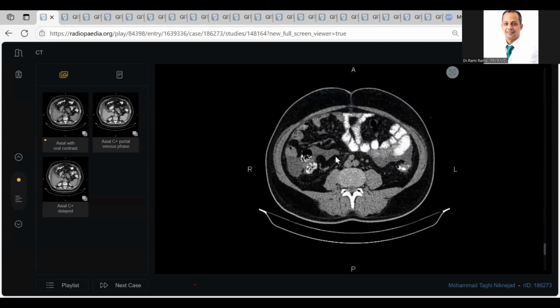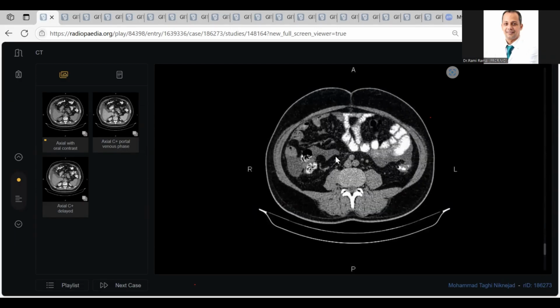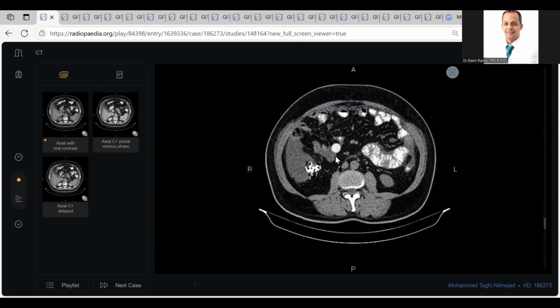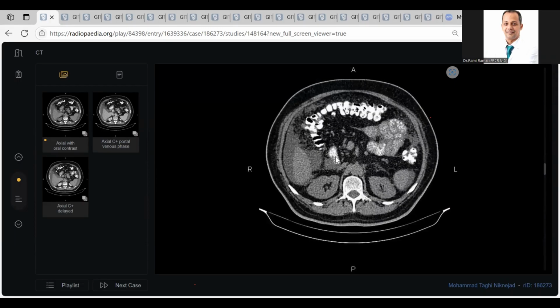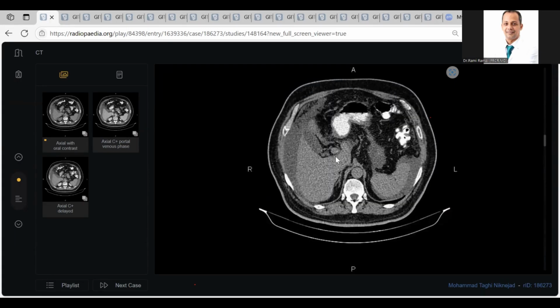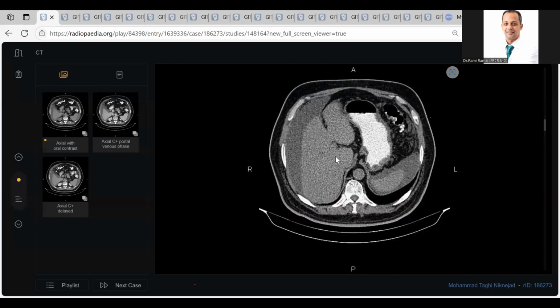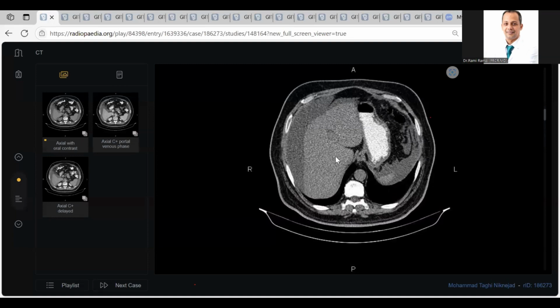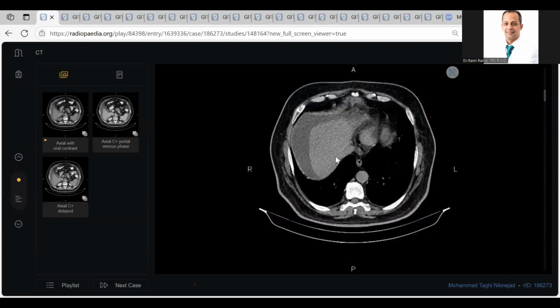Again, I can see changes of omental caking along the anterolateral abdominal wall, and loculated ascites is noted. As I scroll down, the visualized small bowel loops opacified with oral contrast are unremarkable. The pelvis is not included in the provided non-contrast study, and I can see a moderate amount of serous fluid along with omental caking and thickening, and I would like to review this on the post-contrast study.